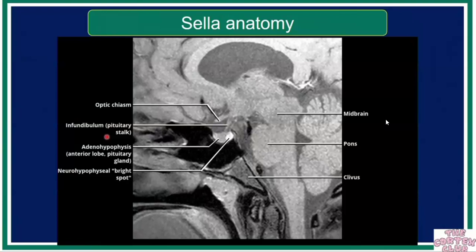We additionally add a coronal T2 weighted image just to see different tissue characteristics, because there are certain types of tissues that behave differently between T1 and T2 weighted images.